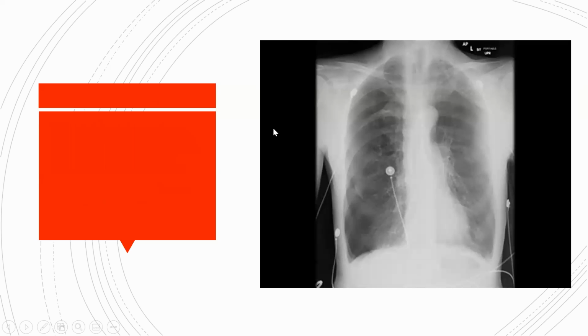Okay, what's going on with this one? Oh, this is a nice one. I like it. I think you guys are gonna like it too. Yeah, the last one, sorry, the last one was very easy, wasn't it? Cardiomegaly, sorry, it was kind of an obvious one. Okay, so I'm getting lots of very good responses here. Blurry borders. Yeah, it's a bit blurry.